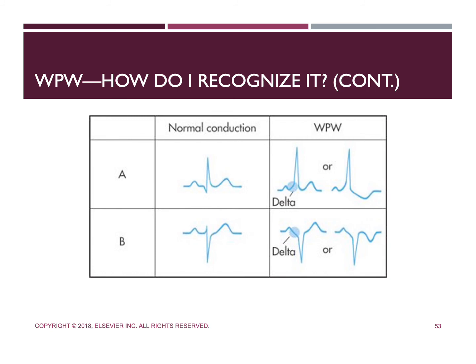Now, as you move over to the WPW column, or once again the Wolff-Parkinson-White pattern, all right, you're going to notice there's a delta wave present. They've highlighted it here so you can see, all right, we don't have that inversion of our QRS. It now goes up because there's a delta wave present.